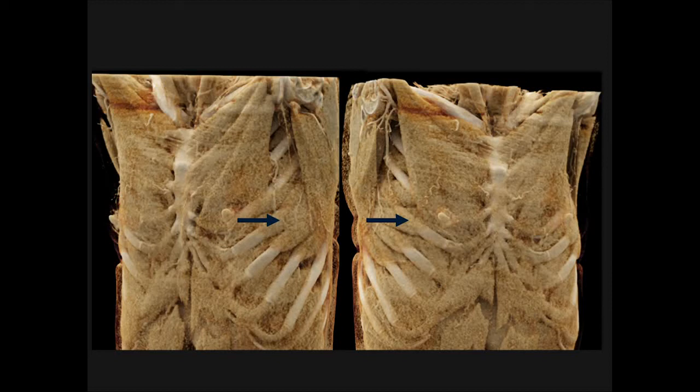I think all of us at times forget to learn the muscle. We know the pectoralis major muscle and pectoralis minor, maybe the latissimus dorsi. We need to know all the muscles. Just a very nice example.